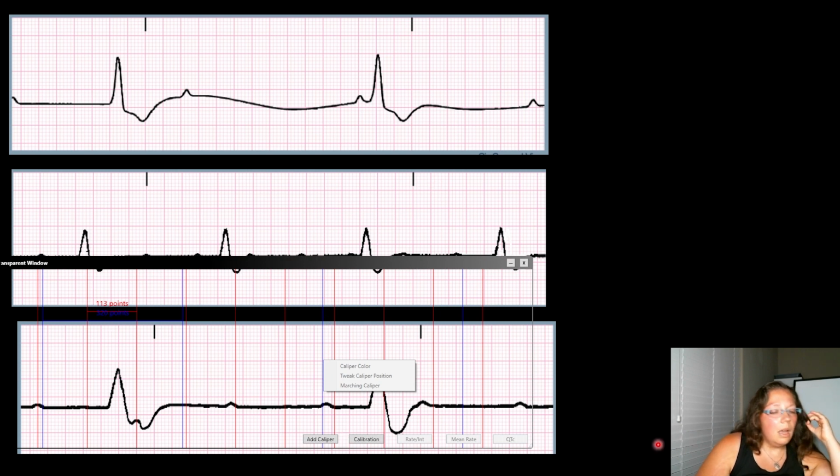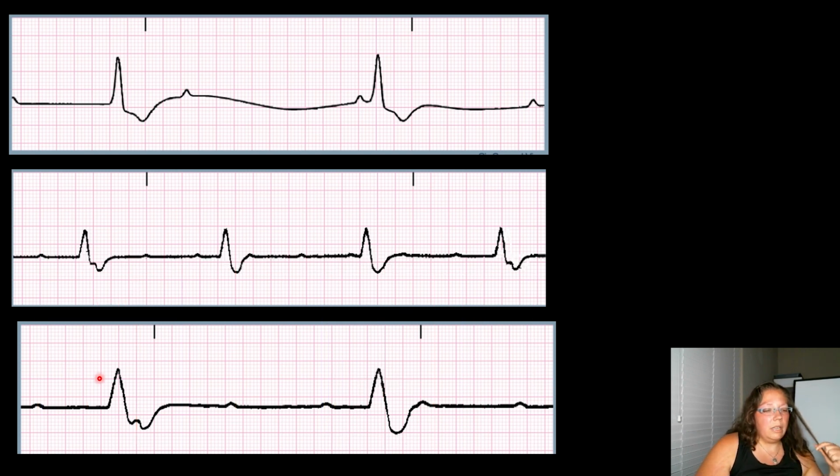We'll just leave it. This one we're also not gonna be able to march out the QRSs because there's only 2. So if this is a 6-second strip, this guy had a heartbeat of 20 and this guy had a heartbeat of 20 as well.